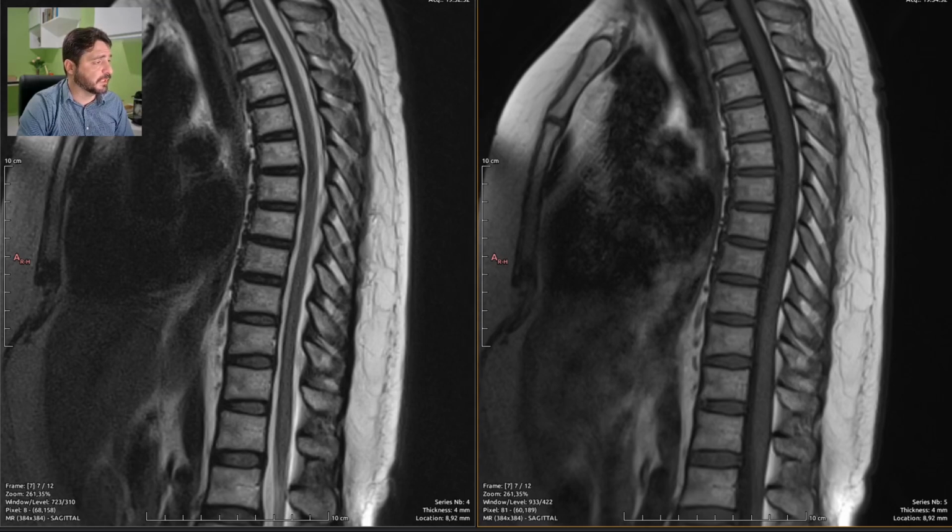Let's grab a template. I have already seen a few signs of pathology. I don't know if you guys have.